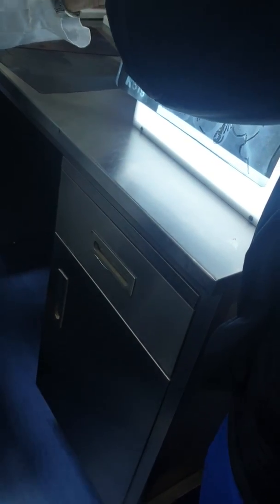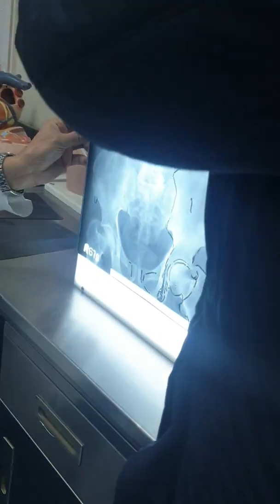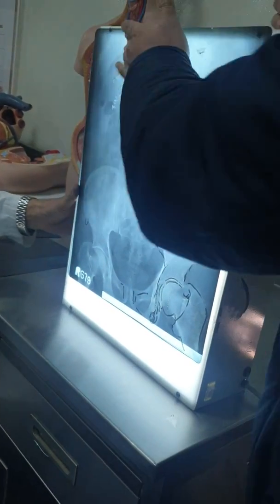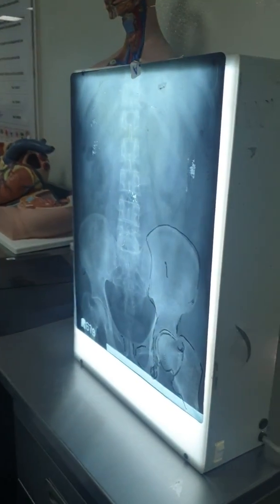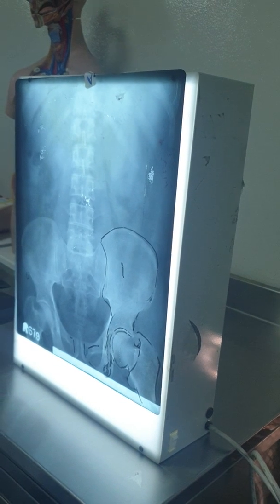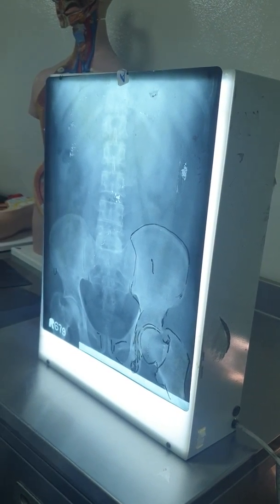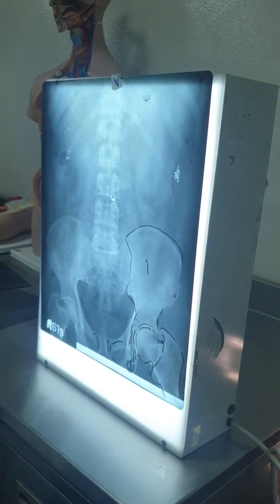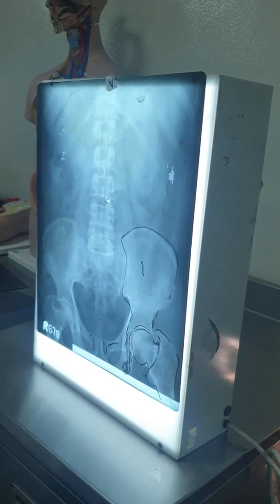You have seen already the chest X-ray, and so we will see here mostly the bones and joints. Two things you can see in the X-ray, and in most of the X-ray it is AP view and lateral view. In the chest you see PA view.